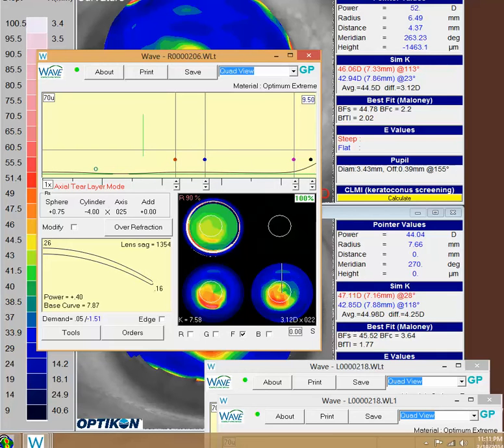your optical zone in your design was about 5 or so. So if you take 5, that gives you a little area out here where you're more likely to have touch, with a little more standoff in this area. So I already moved this down to about 4.5. A lot of times when you're fitting these designs, ideally you could bisect that cone a little bit, but that would make a pretty small central zone, although you could use that.